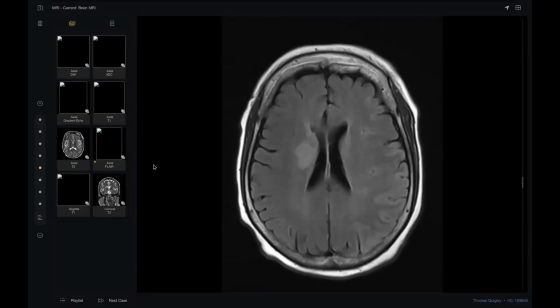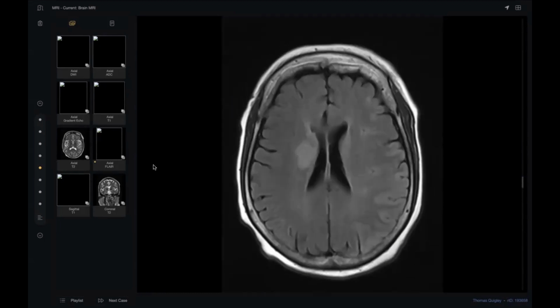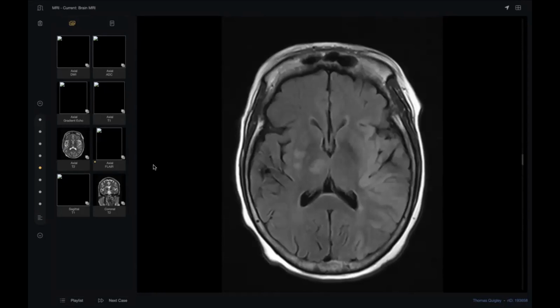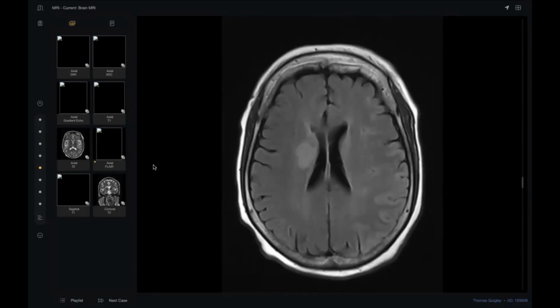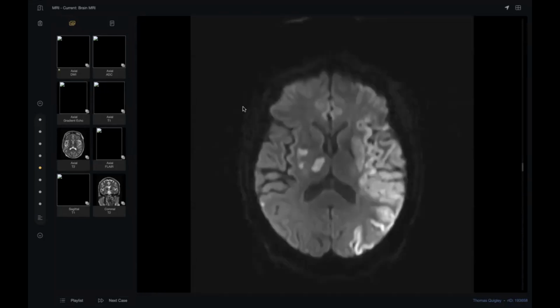I'm waiting from this one. If you see this one, you tell me, oh doctor, this is a brain of the same patient showing multiple territory high signal. It looks like it is scattered all over the brain, more at the left. So it looks like a showering emboli. Thank you so much. See my colleague here: 1, 2, 3, and here along the MCA and the PCA. Okay, so there are showering emboli.